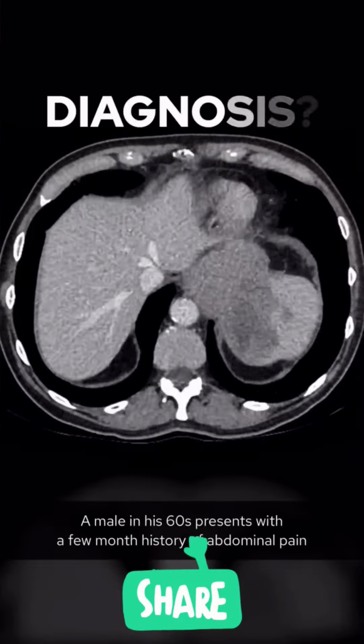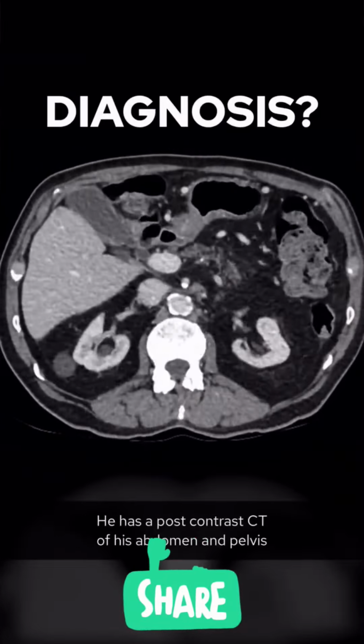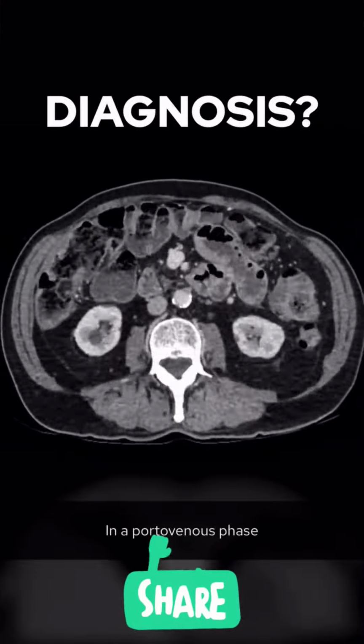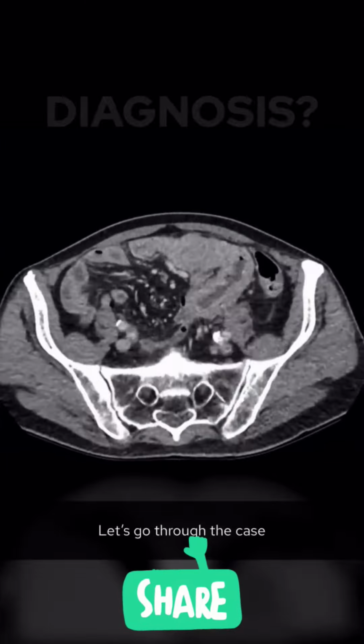A male in his 60s presents with a few-month history of abdominal pain. He has a post-contrast CT of his abdomen and pelvis in a portal venous phase. Can you see the abnormalities? Let's go through the case.